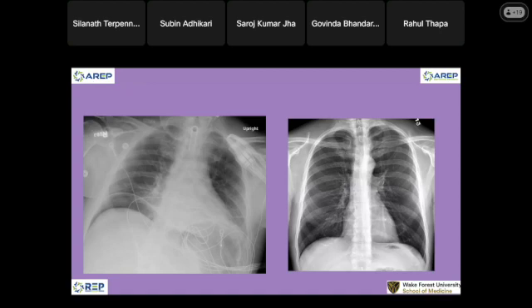So in this case, you look back into the history. If the patient has a history of prior procedure or recent surgery, forget about it, it's expected. But if there is no history of surgery or procedure, so all three things that he's saying: you need to call the clinician and do a discussion of patient history and prior study. So those are very important. You probably need to do something because this is not normal.